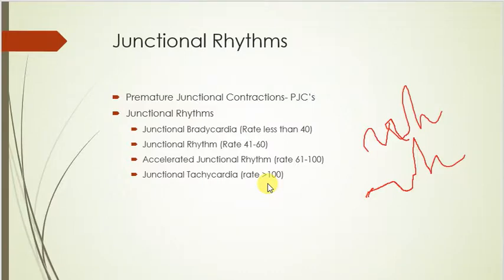I really just think that we needed to run through this because, in the book, it does talk about junctional and the different rhythms. But if you can just tell me it is a junctional rhythm, then I am fine with that, identifying that junctional rhythm.